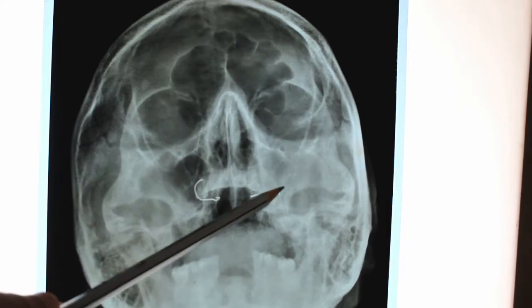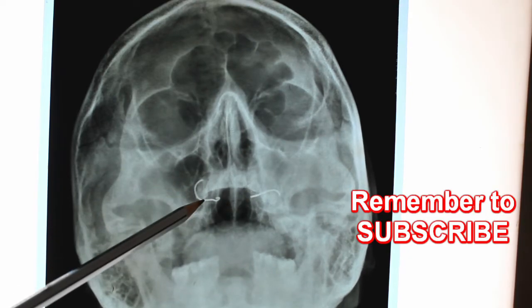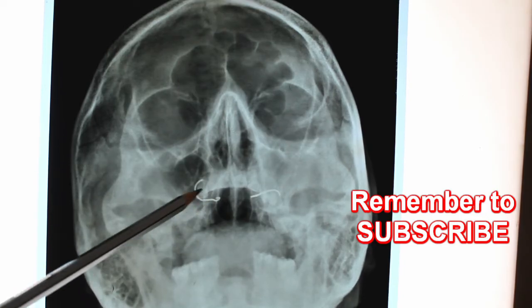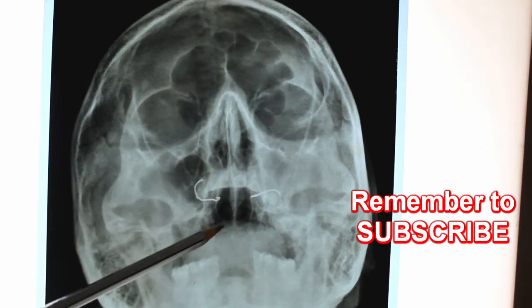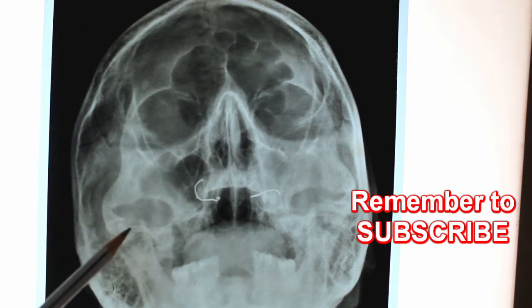What is this? This patient had an RTA, and there is wiring done on the maxilla. That is it. Okay. And this is occipitomental view with open mouth. Always while reading an X-ray, go in a systematic way, identify the anatomical landmarks, and then go.